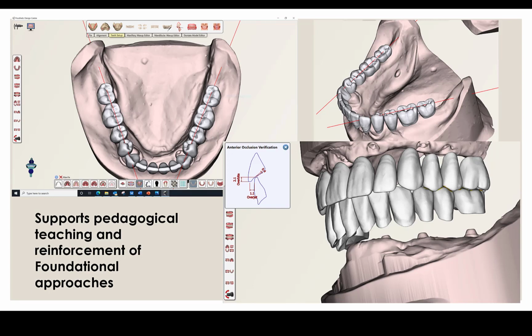Students can more easily treatment plan patients while actively creating prostheses according to soft and hard tissue present, implant angulations, etc. They can also perform model extractions and surgery, examine clearances, and better appreciate functional space from any angle. Foundational rules on tooth setting are supported, including setting posterior mandibular teeth on the center of the alveolar ridge and vertical and horizontal overlap visualization in the anterior area so the user can optimize their tooth setup.